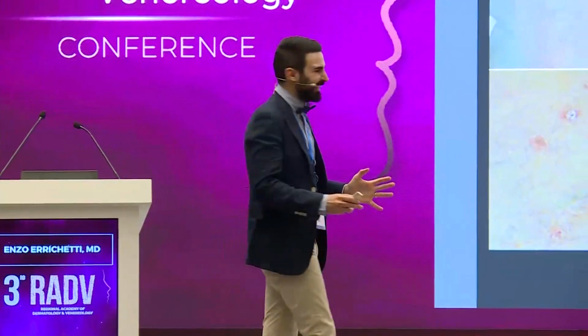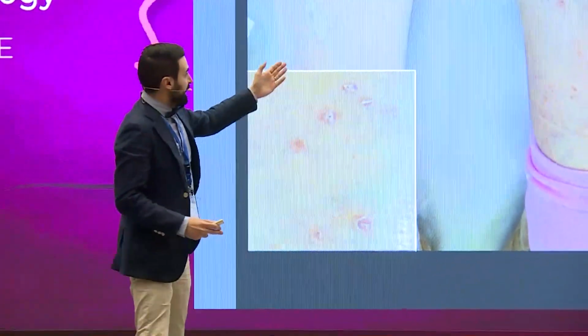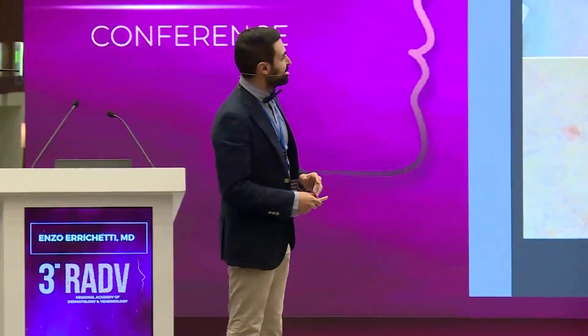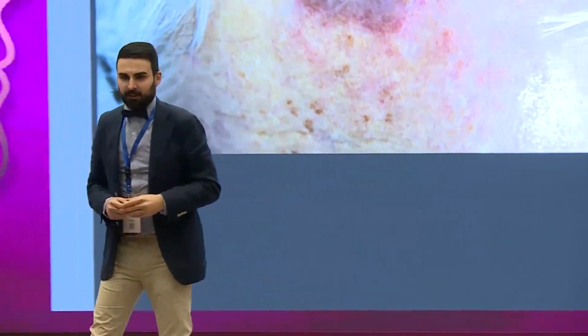Come on. Sarcoidosis. Sarcoidosis may present with several clinical patterns, also as a papulosquamous dermatosis. Okay? Great. Now, we have this case. This is difficult. It could be, of course, sarcoidosis. I agree. It could be lymphoma, pseudolymphoma.